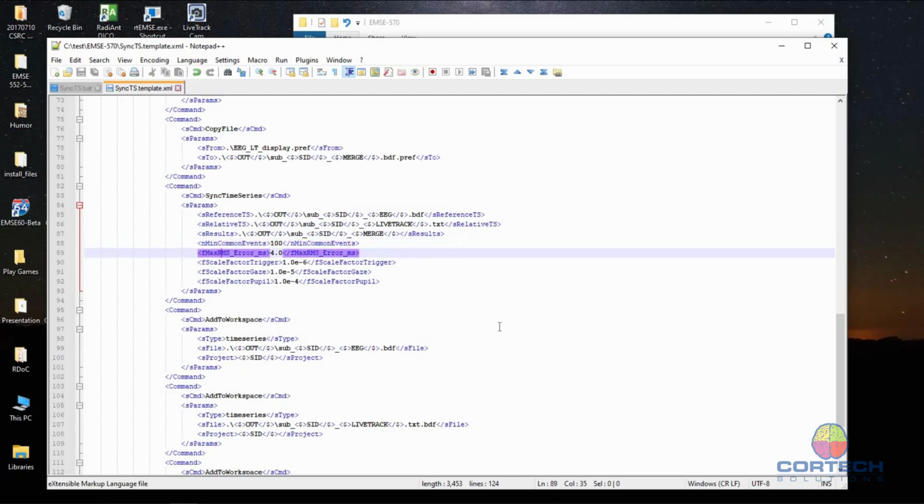The next one is after alignment. The alignment procedure is to fit a line through the timestamp data. The line will have an intercept. That intercept will be the offset between the two data sets. One data set would start, say, at an earlier or later time compared to the other. That's the offset.